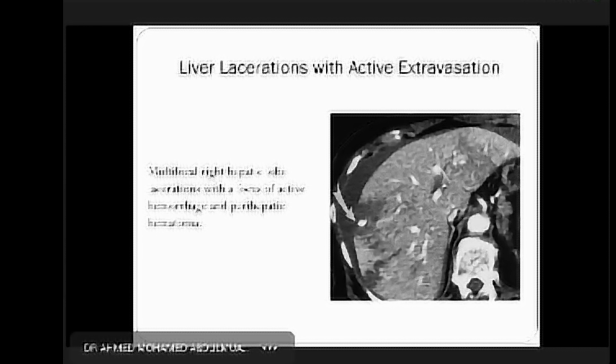Then we scan all the liver and see what segment of the liver is damaged, and whether it involves the major blood vessels of the liver. Is there any laceration to the other organs of the abdomen? Then we can stage it and send our staging to the surgeon, and they can plan further management. So CT scan is one of the best modalities to show the detail of the abdomen if there is any laceration or injury to the solid organs, especially in trauma cases.